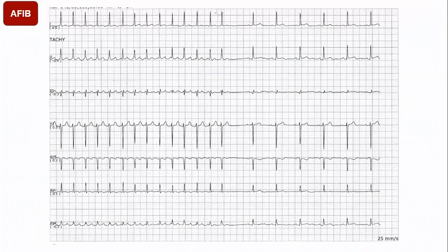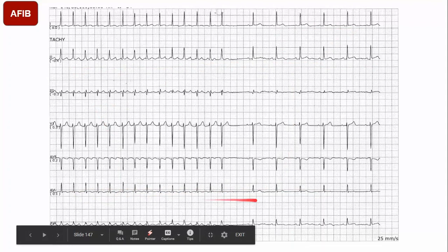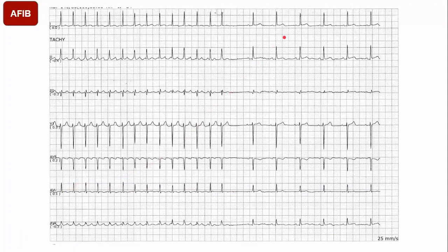Look at this. This is another example of atrial fibrillation. The rhythm is irregularly irregular and there are no visible reproducible P waves. We say, well, look up there, there's one. It is irregularly irregular and there are no visible reproducible P waves. Over here, we don't see those P waves. But what you have to appreciate, in this strip, which is a little on the tricky side, is that this rhythm strip is recorded at a different time than this one up here.